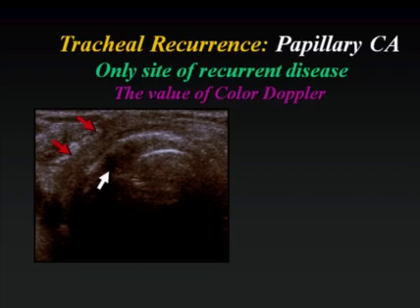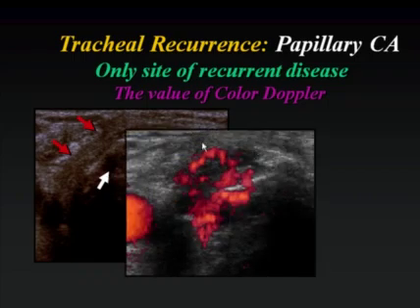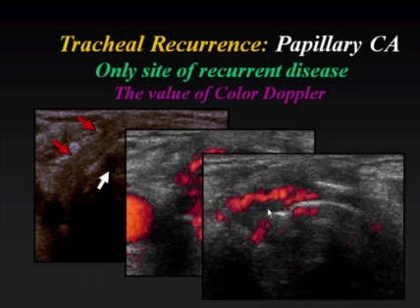The color can be very helpful in looking for a variety of thyroid bed recurrences. And here's an example of very subtle increased thickening of the soft tissues around the trachea. We can see subtle widening of the trachea here. And with increased flow, we can see that there is a more clearly evident hypoechoic soft tissue mass that is really richly vascularized. And this is an extensive recurrence that's invading the trachea. And the hallmark is hypoechoic tissue that's richly vascularized.